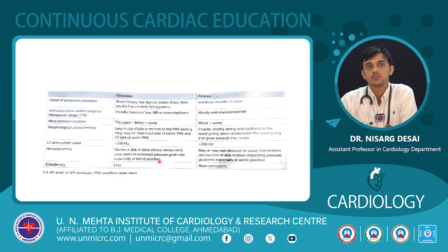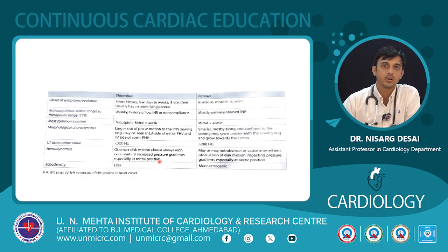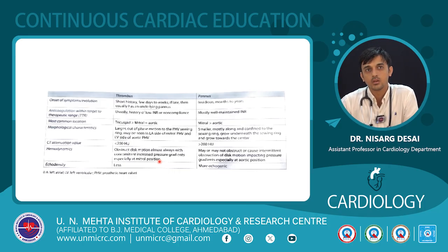Morphologically, the thrombus is large, with out of phase motion to the prosthetic heart valve, whereas pannus is smaller and most commonly confined to the sewing ring. The CT values, if we go for a CT, the thrombus is having less than 200 Hounsfield units, whereas pannus will usually have slightly more than 200.